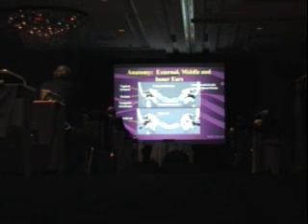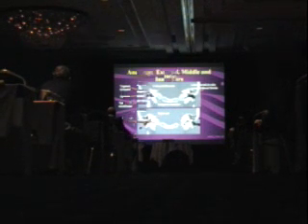So if you see it in an adult, where do you look next? You look in the nasopharynx to look for a cancer, and you tell that patient to get a laryngoscopy. Because more often than not, there's going to be a little cancer that's blocking the eustachian canal and making fluid fill up in the middle ear. So that's very important in that location. That's something you want to look for.